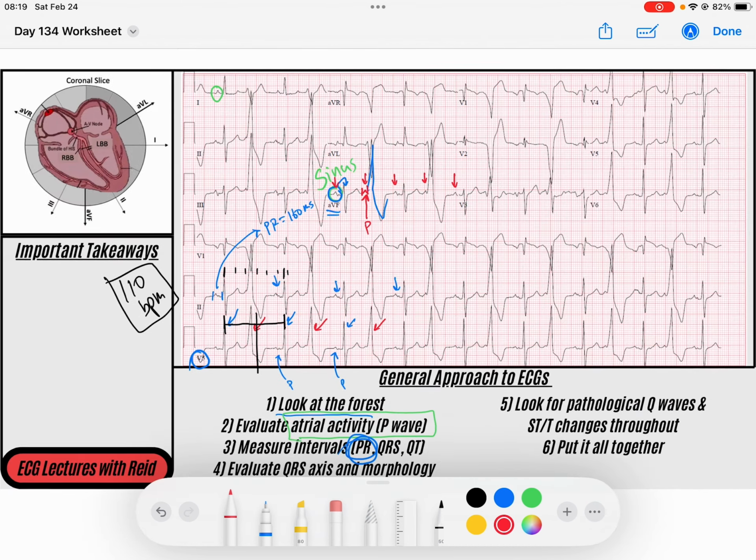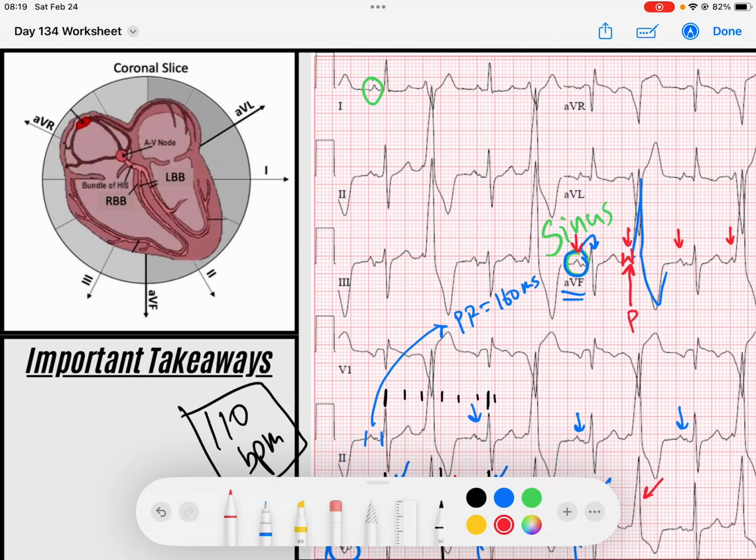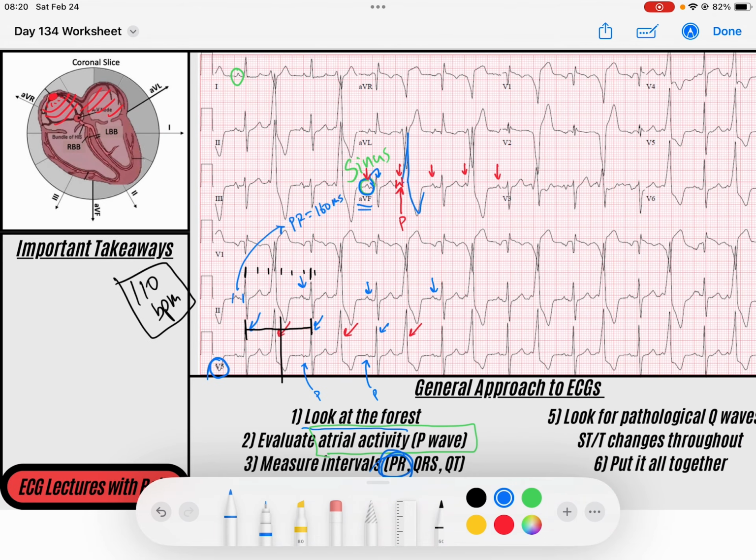Well, what I believe is going on is, we have a sinus P wave that we noted coming down the atria, right? And we're getting that P wave. But right as that P wave terminates and gets to the AV node, at the same time we are getting some type of premature ventricular contraction, coming from the ventricles, firing off, creating slow cell-to-cell depolarization through the ventricles.